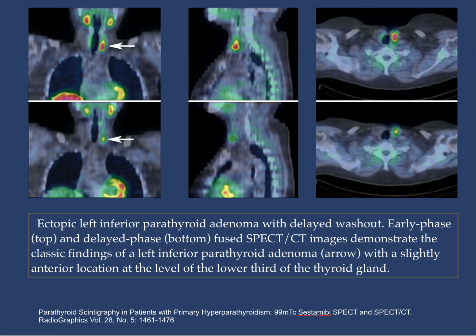These are typical images for a SPECT that presumably, again, should solve the problem of whether it's a superior or inferior gland by providing accurate anatomical localization. In my prior experience, it doesn't seem to be a solution due to the really poor quality of the CT images of a typical SPECT-CT. However, the technology is not standing still, and I'm sure the latest generation of these studies improves the localization.